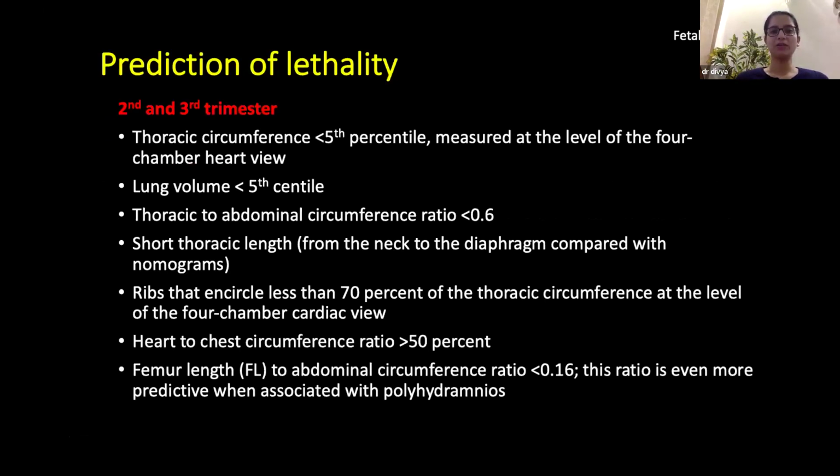Now, when you come across a skeletal dysplasia in the second or third trimester of pregnancy, there are a host of measurements that you can take in order to make a more confident diagnosis of lethality. Please remember to try to satisfy as many points as possible, because the more points in your favor, the more likely you are to be making a correct diagnosis of lethality. That being said, it's not always possible to identify lethality due to a skeletal dysplasia in the antenatal period by ultrasound alone. Sometimes postnatally, you might find individuals who were thought to have a lethal kind of skeletal dysplasia surviving into childhood.